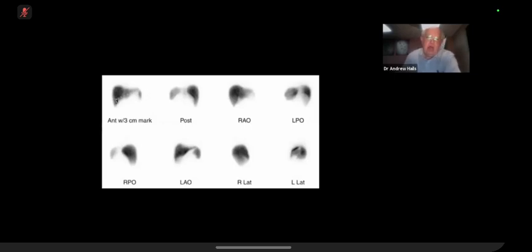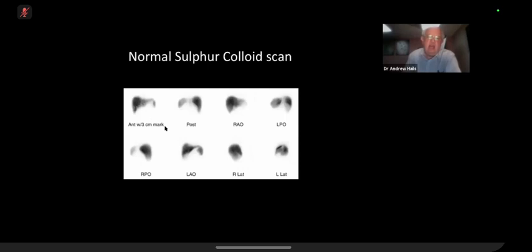And you can see here people have put little lucences, maybe little radiopaque markers along the side of the patient's ribs to show where the bottom of the liver was. So to give you some idea of the size. This had its heyday years ago before CT was widespread. And it was a way of looking for focal defects in the liver.